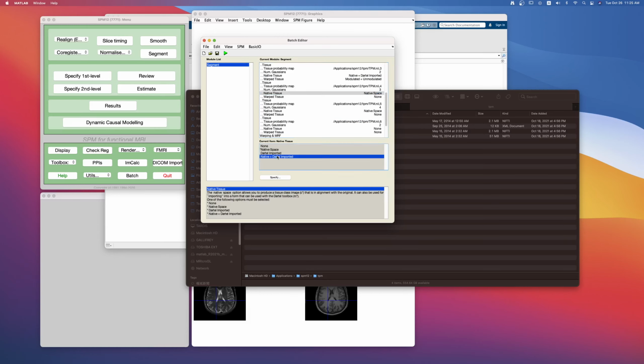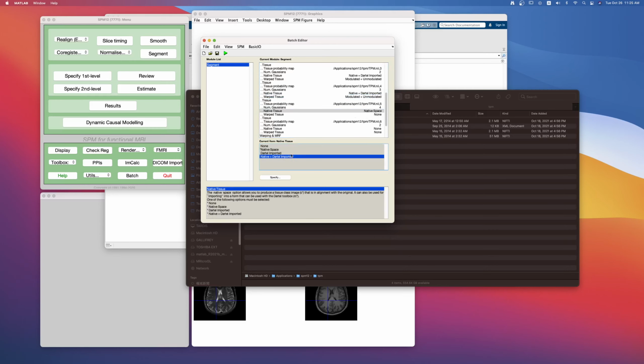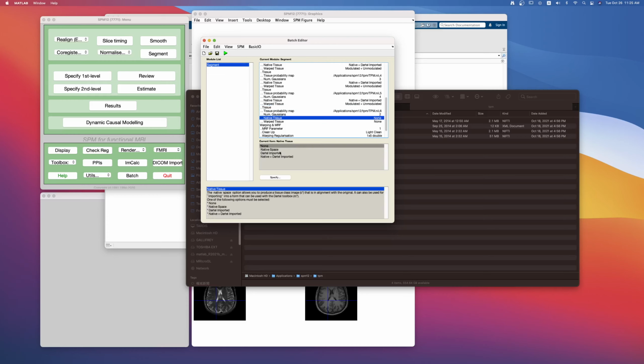And the fourth frame, I can't remember what it is. It's probably skull or something. But it's really not so important after frame 3 for the most part. The key ones are really the CSF and the white matter.